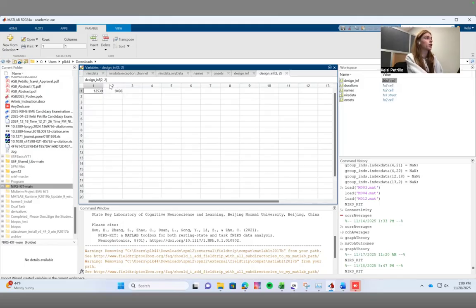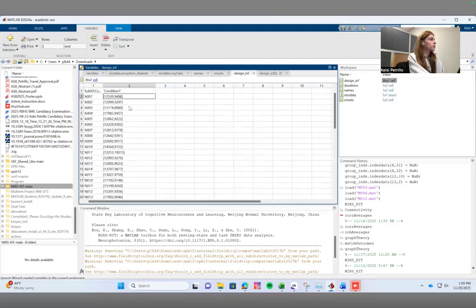And then the duration of that event is going to go into the second cell. So this person did this event for approximately 9,000 samples. And then you can see we've done that for each participant. And you may be asking yourself right now, well, I thought you mentioned you also had a rest period. Why aren't we seeing that here?